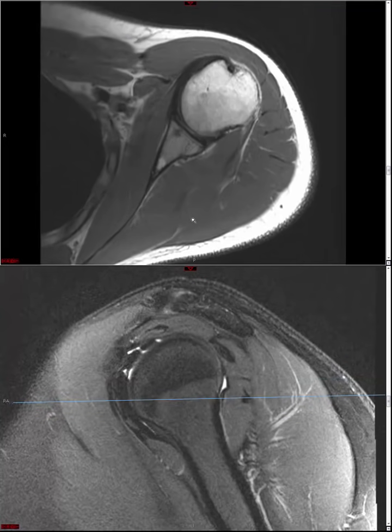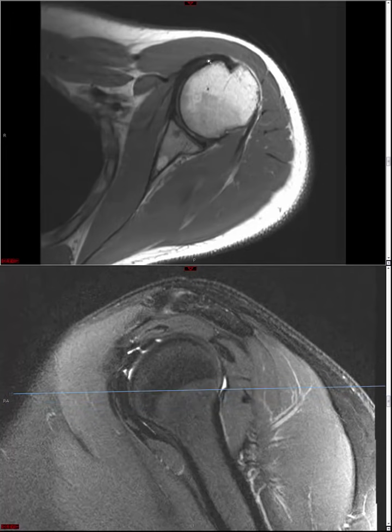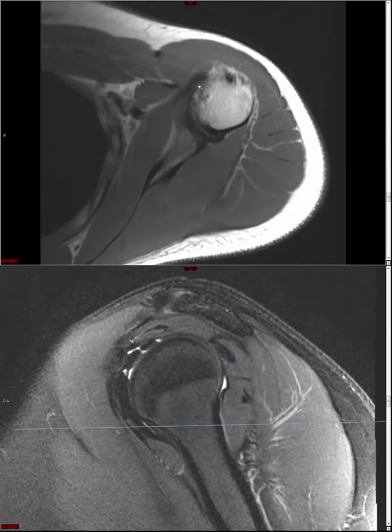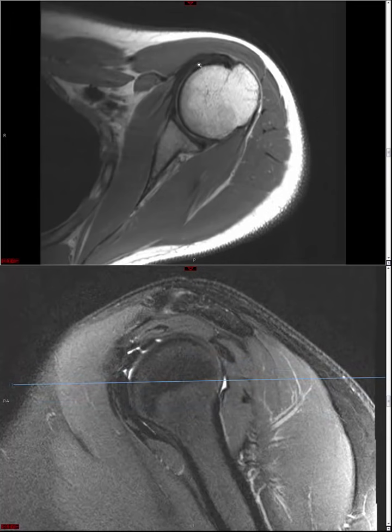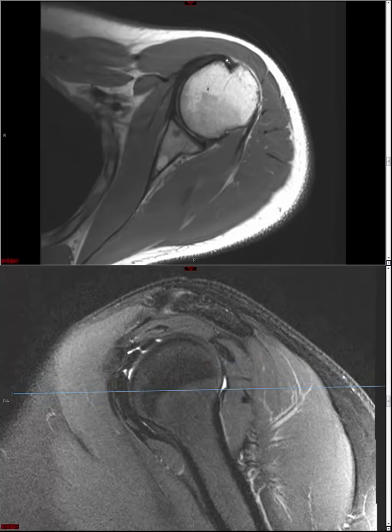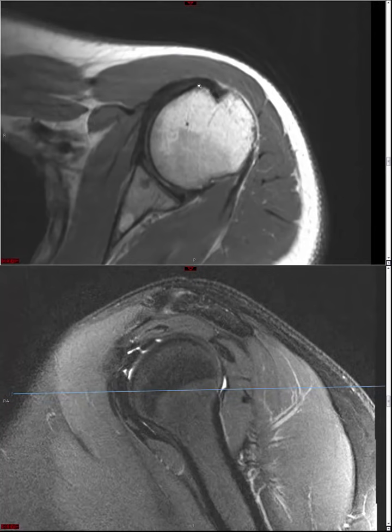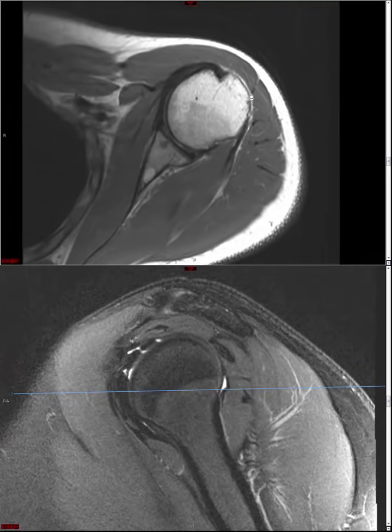All right. The reason why I read biceps with subscapularis is that very often when you have a partial tear of subscapularis, especially a partial thickness articular surface tear of subscapularis, you may see subluxation of the medial biceps. Sometimes it's easy, it's frank dislocation. You see an empty bicipital groove, and if you judiciously follow the biceps tendon up and down, you can see it's actually medially dislocated into that subscapularis tendon tear defect. But sometimes it's subtle, and it's just subtly perched medially on the lesser tuberosity. Okay, so very subtle subluxation.